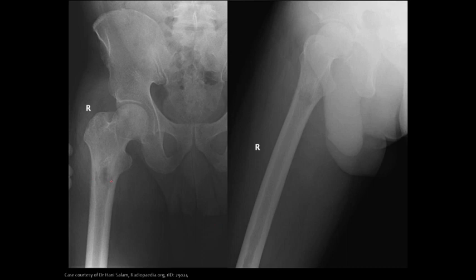In this proximal femoral metaphyseal region, we can see an area that looks almost like a geographic osteolysis, maybe in this portion only, but it does still have these almost wings to it, and we have some endosteal scalloping here on the A to P view.